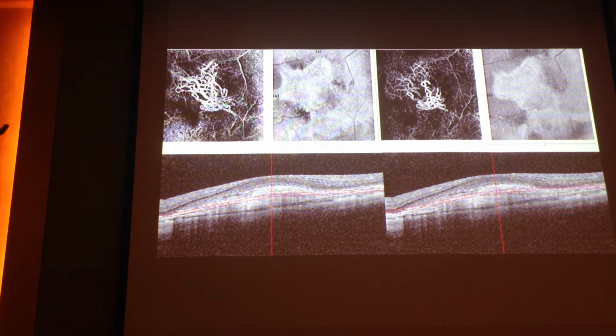One of the interpretations of choroidal neovascularization with angio was that you actually can interpret the flow. So if you have a higher flow, it's brighter. If you have a lower flow, it's darker. But it doesn't make any sense for two reasons. One is that you have two time points, so that it's the only possibility.